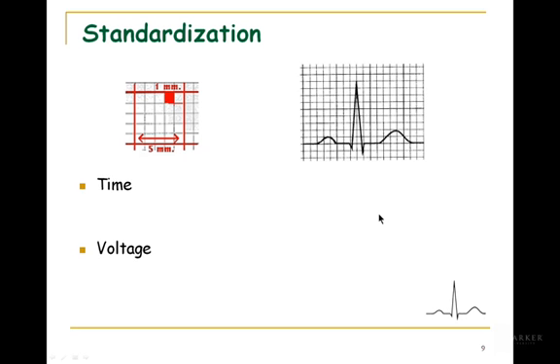What about the Q wave? Here's the Q wave. That's a downwards deflection. That's one box, but since it's downwards, we're going to say it's minus 0.1 millivolts. What if I asked how long it took for the ventricles to depolarize? You should know that the QRS complex represents depolarization of the ventricles. To make it a little easier, we're going to say it started right here in this line.